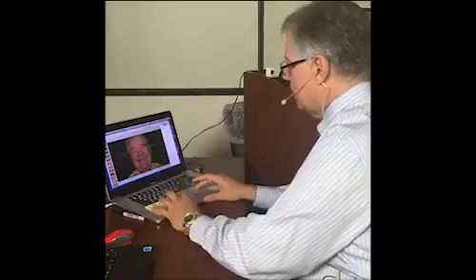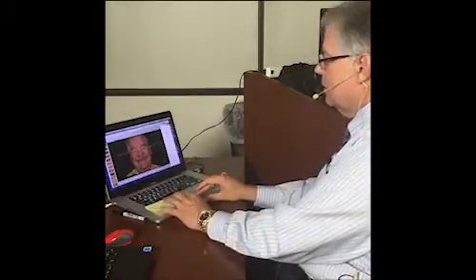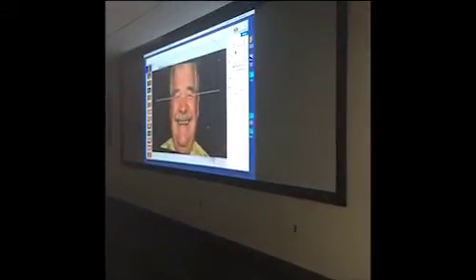I'll come over here to Arrange. I'll hit the picture, Arrange, and down here I have a thing called Angle. It's going to let me angle the image. So I just can tip it. Now, what do I know? That's how he is in space. If I want to use imaging to diagnose and do aesthetic stuff and then plan, I'd like to know where his face is in space. I want to know where the teeth are.